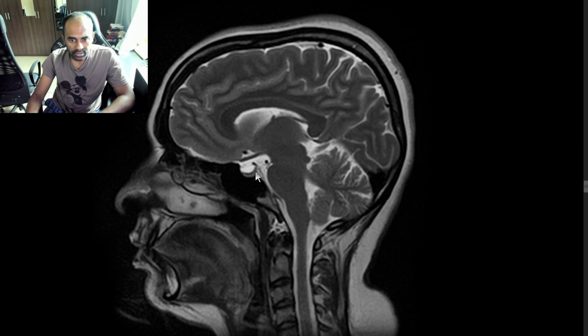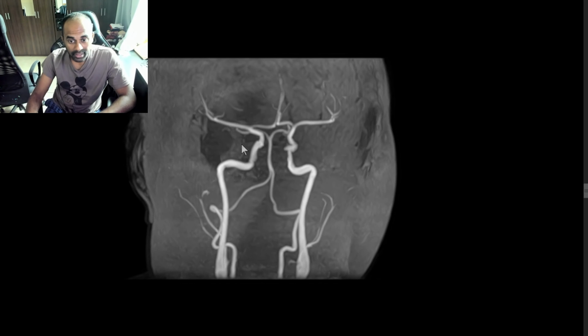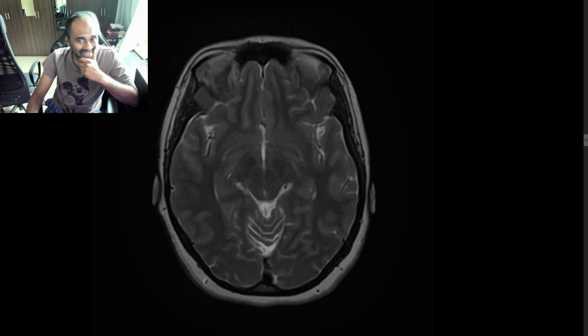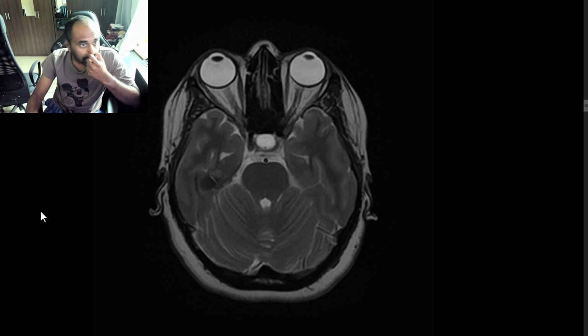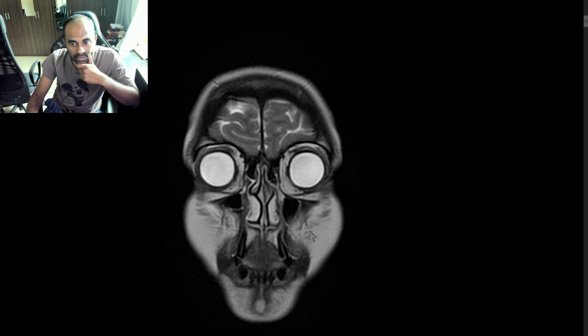in these sort of patients, when you have only certain subtle findings, like for example, most of the study is unremarkable, you have no positive findings, you need to have a look at when there are isolated findings like partial empty sella, prominent CSF volume in the sella turcica. Try to look at, for example, the perioptic CSF space. So if you have other sequences which have been taken, maybe you can look at coronal sequence.